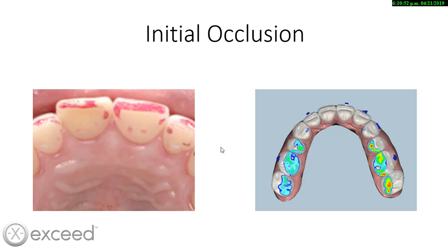One good tip that we can use is to take the occlusal photos of the patient with articulating paper marks. So later we just go to the occlusogram, we go to stage number 0, and we make sure that those contacts are just the same. So for example, here in the picture, we have anterior contacts. But when we go and we see the 3D model, we are not seeing any anterior contact, so we know that there is something wrong with that bite.